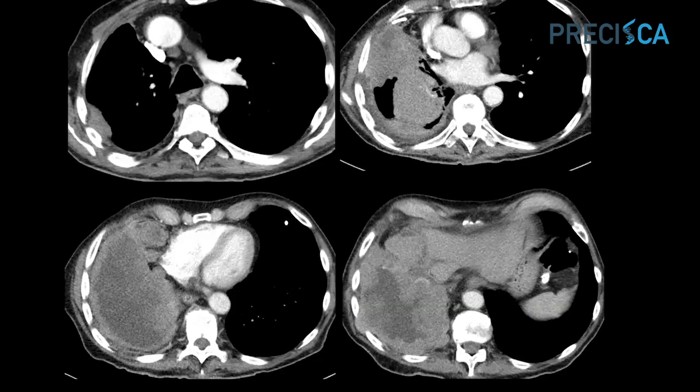This was a 67-year-old man who had come to our institution with a recurrent pleural effusion and then underwent a CT examination for further evaluation. One of the things that always comes up is, when do you start to worry whether a pleural effusion is a malignant pleural effusion or is representative of something infectious or inflammatory, like a fibrothorax, especially if a patient comes to you with an occupational history that could suggest that they've had pleural plaques or something along those lines.